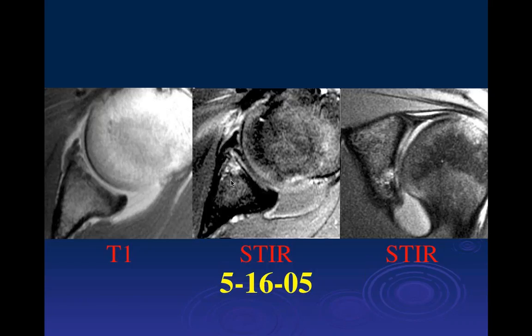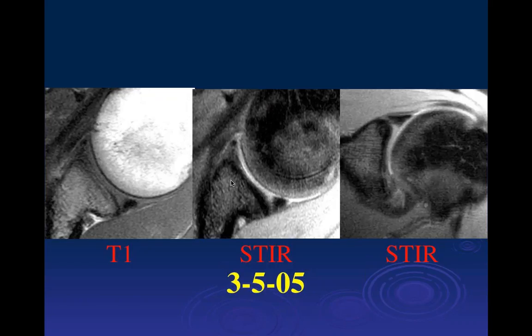I have a question on the original case, just one slide back. So if you see this, and I'm presuming it's a young patient. Yes. And you see this intermediate signal intensity of the anterior labrum, do you just say suspicious for tear, and that's all you say? Because if it was an older patient, say they were 60 and you saw this, would you say degenerative tear?